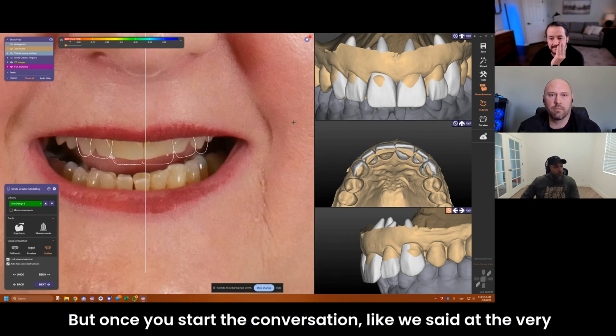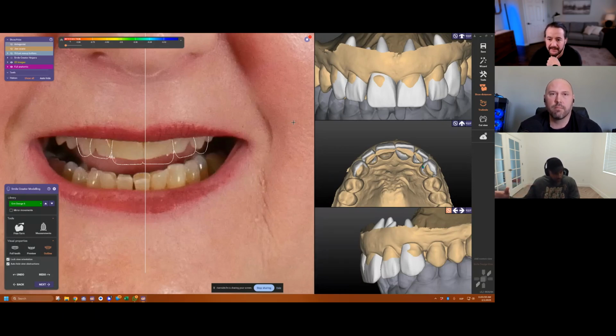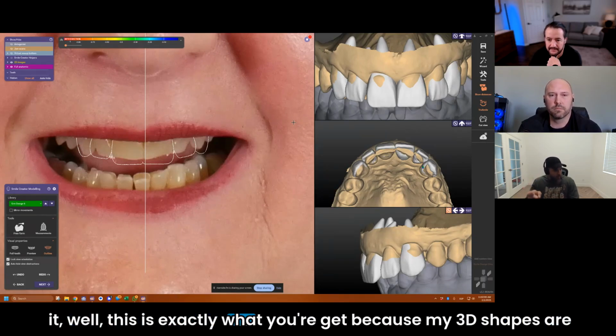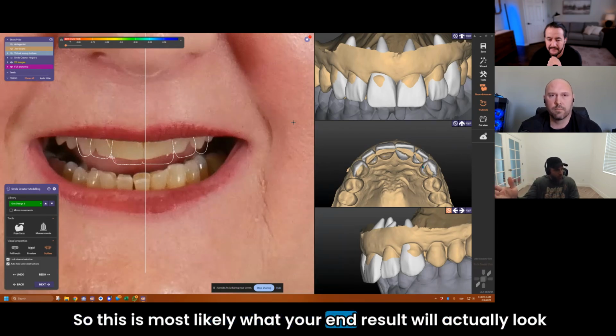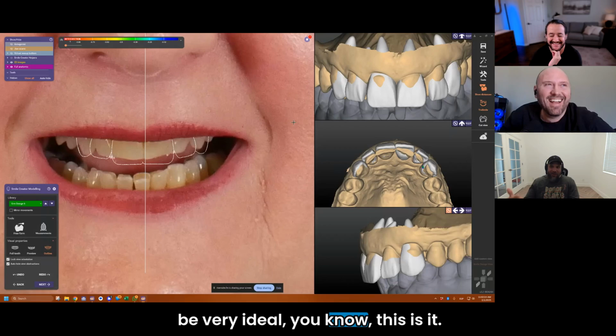But once you start the conversation, like we said at the very beginning, you're starting the conversation with the end product in mind. So by the time I'm done here, if I send this and the patient loves it, well, this is exactly what you're going to get, because my 3D shapes are in correct space and following your anatomy. So this is most likely what your end result will actually look like. And so I don't have to make any caveats, any fine print. Results may vary. This is it.